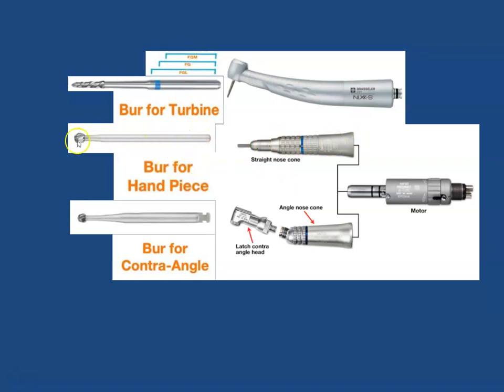but these burrs are very long, and both of these connect to a motor. Unlike here, where there's a turbine, these have a motor that connects into it, and this one has a motor.